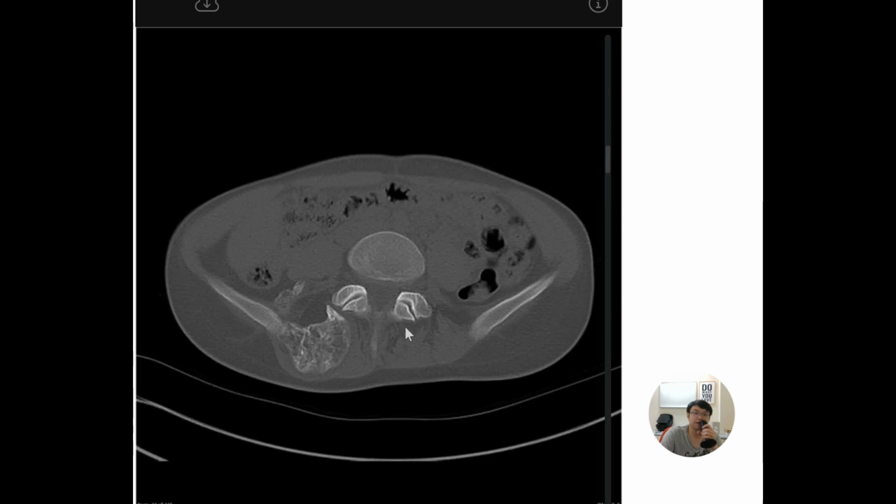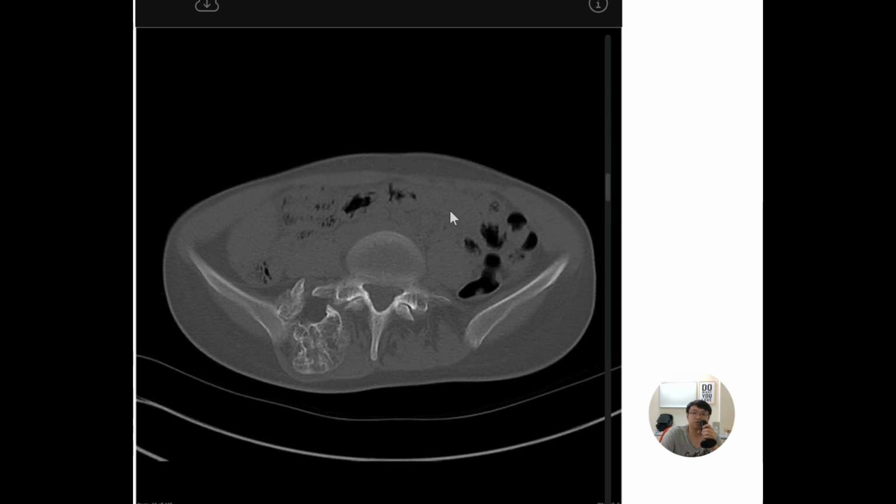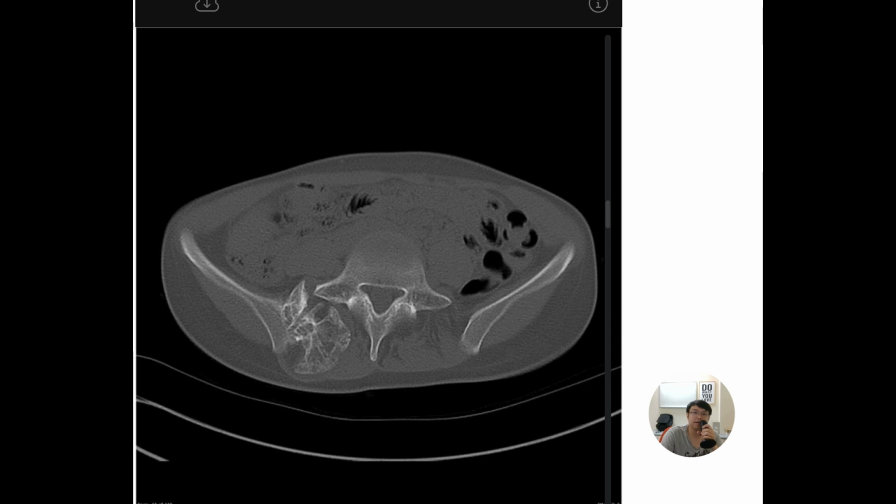With osteochondroma, you all know that we need to look for any sign of malignancy. Of course, the best way is to do an MRI, but if you only have a CT on hand, do know that there is a thin layer of cartilage cap, which has a propensity for malignant transformation. So what do we look for on CT to assess for malignant transformation?